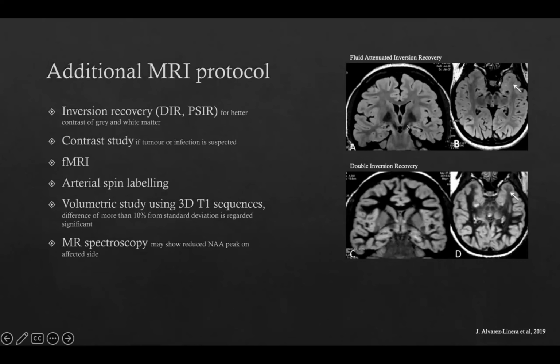If you look at this image, the upper row would be the FLAIR. This is in all other protocols, okay? You will have this FLAIR. But inversion recovery, usually we will put it in the epilepsy protocol.